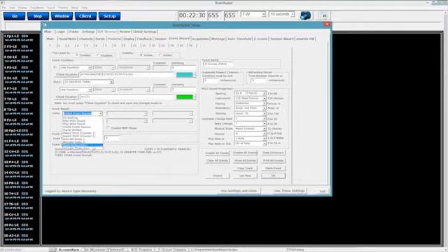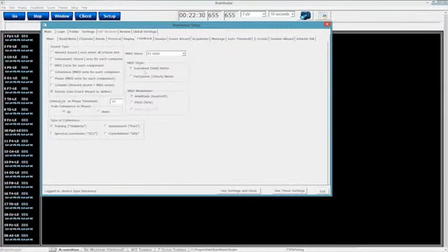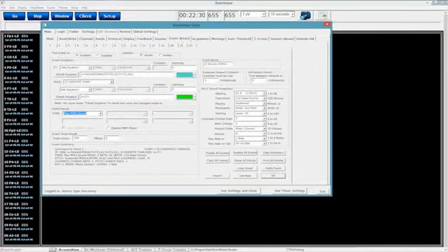And then there are 2 other features, flash photic once or activate photic stim, for those of you who have a StimFlash. So that would be our event result, which is basically the exact same thing as our feedback right here.